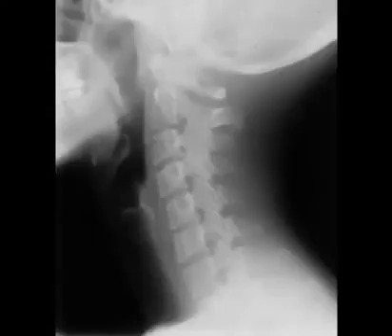On the lateral cervical neutral, the anterior arch of the atlas is visualized in this location. I'm going to make my pen size a little bit smaller because that line is a little too big for what we need here. Now the posterior arch is visualized here. Now for some of you more experienced viewers, you'll notice that this patient has this density here. It's just calcification of the atlanto-occipital membrane in the region of the arcuate ligament.